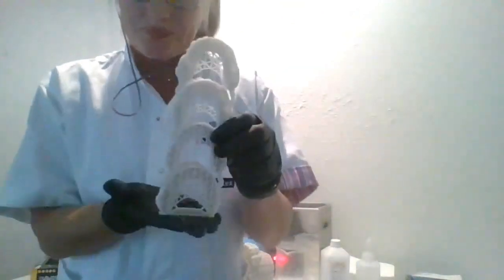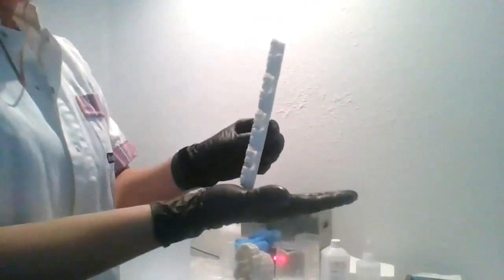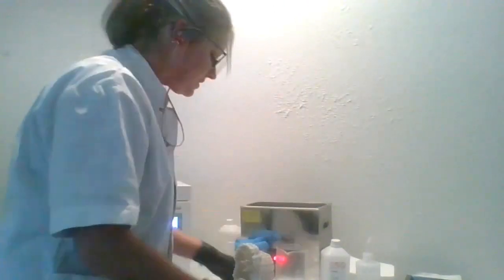Okay, so here I have a build I just did, and I actually took one of these stacks off. If you plan to use these little feet here at the bottom, and in fact, let me show you what I just cured, you can actually cure these standing straight up in the cure oven. It has little feet on the bottom here. So if you're going to utilize this full stack at the end and you're not going to break them apart during your cleaning process, then you're going to use your little punch tool and you're going to punch from the bottom. I just lay it down and punch from the bottom.